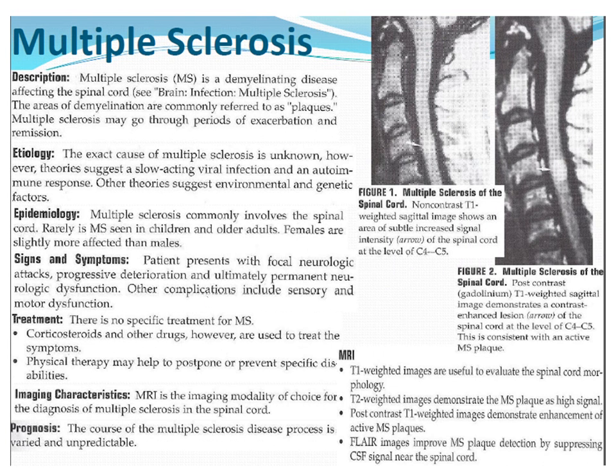So this is multiple sclerosis, which you may have heard of. We most often see it in the brain in patients with multiple sclerosis. It's a demyelinating disease, and in the brain, I'll just mention briefly, you see these T2 bright areas. They're bright on T2 weighted imaging and FLAIR, just scattered all around the white matter. You can see a similar finding in the cord where you'll just see T2 bright areas. And then after contrast administration in both the brain and the spine, you may see some contrast enhancement if it's an active plaque, if it's actively demyelinating.